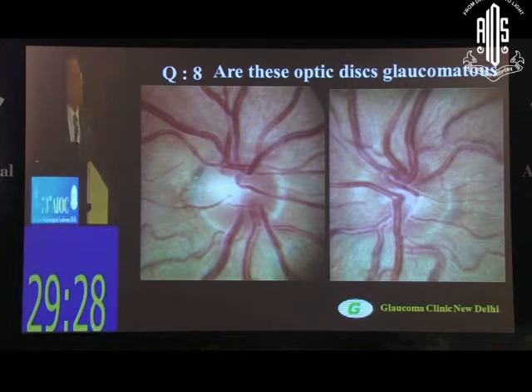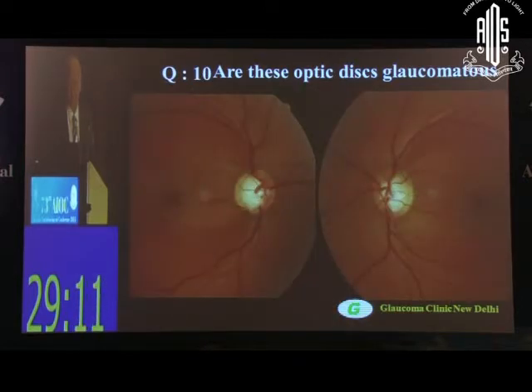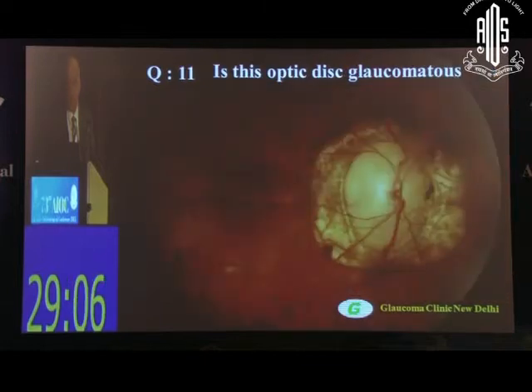Are these optic discs glaucomatous? Is this a glaucomatous optic disc? Are these optic discs glaucomatous? Is this optic disc glaucomatous? So when we say glaucomatous, we mean, does it make you think in terms of a high suspicion for glaucoma?